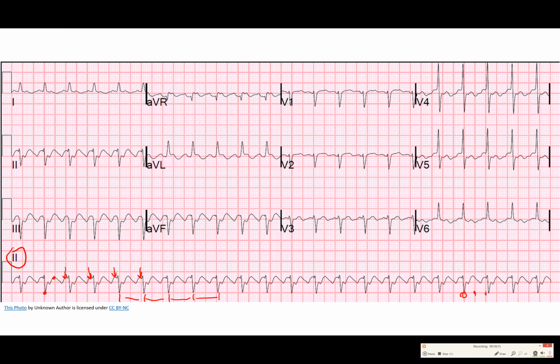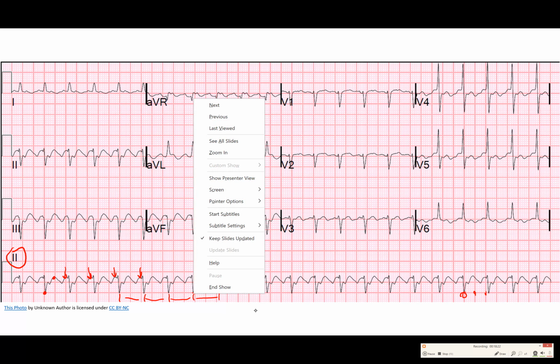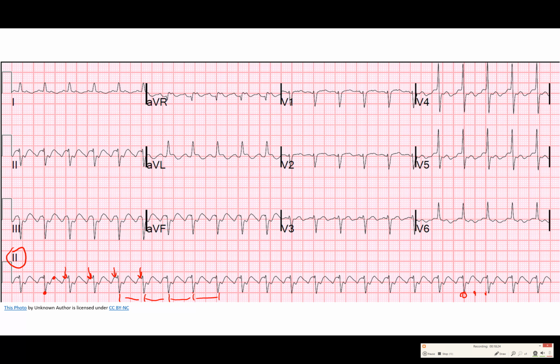If we take another example, let's say this one here, that one's just before the bold line, and that one's just after. So it's probably just a little under 150, but very close to 150. In fact, if you counted all of the boxes and all of the QRS complexes, you would get almost exactly 150 if you did this the longhand way instead of our cheating way.